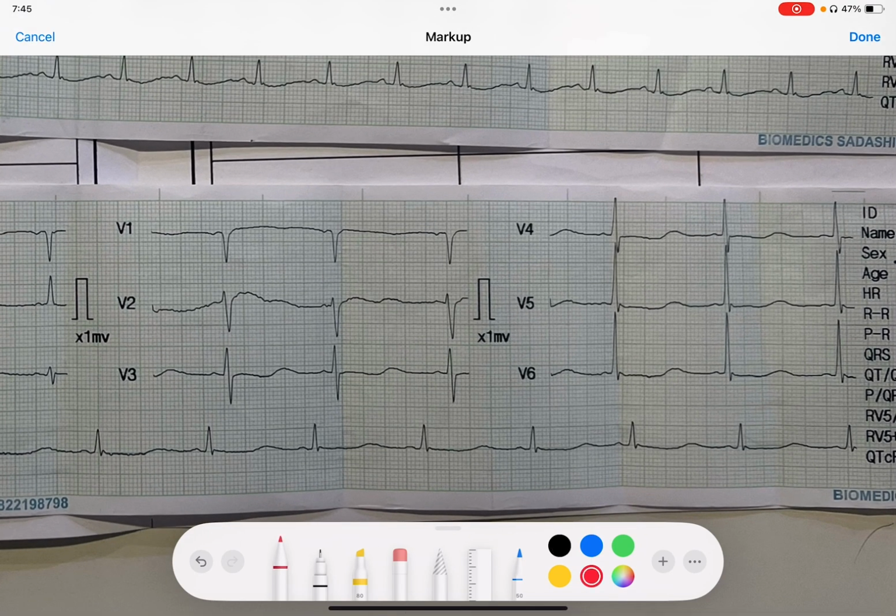We can see that the QRS complex is pretty good. When we look at the P wave, it is pretty well localizable. P wave is here, P is here, P is here, P is here. So the P waves are pretty okay. They are there and they are everywhere.